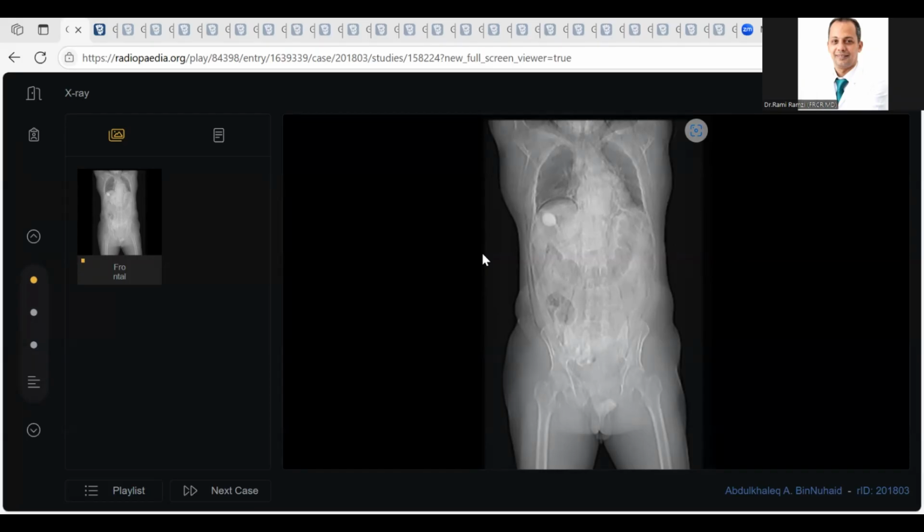In the abdomen, I can see a gas-filled prominent transverse colon. However, a paucity of air is noted in the lower abdomen, especially in the pelvic and rectal region. The left diaphragm also appears slightly heterogeneous. So for this, I will suggest an urgent CT scan to locate the cause of pneumoperitoneum.